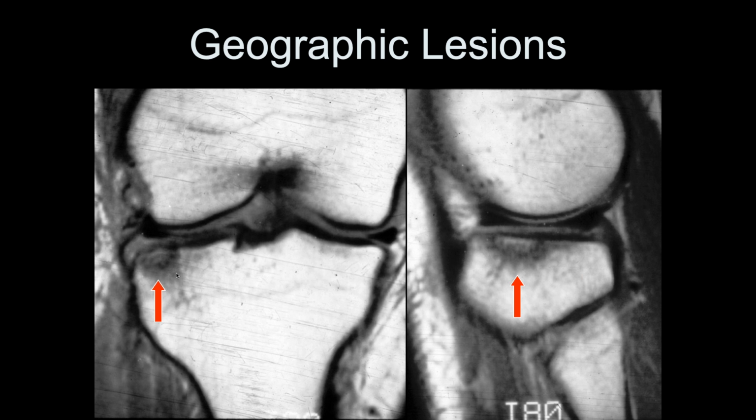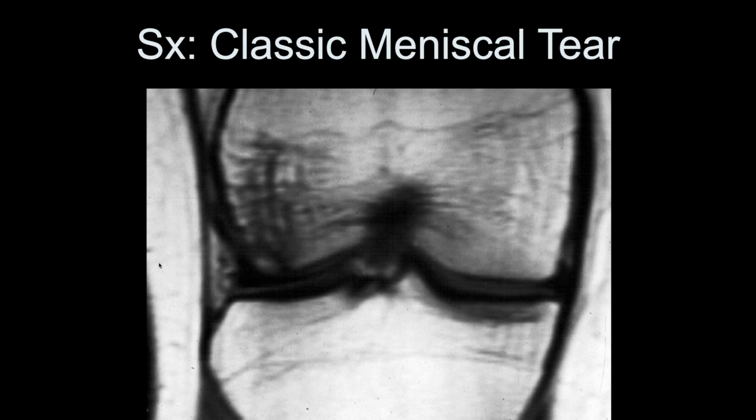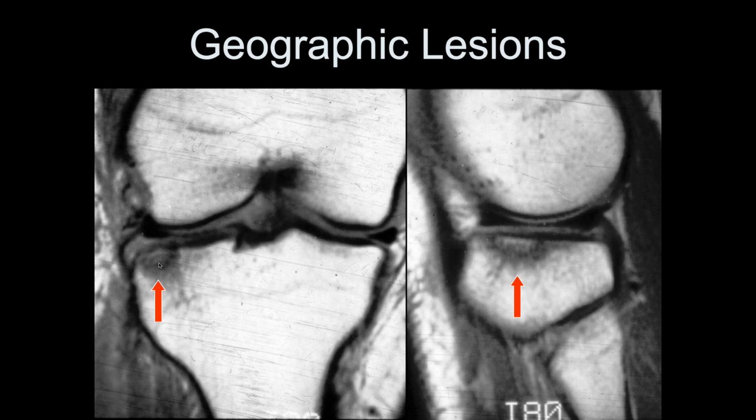In the majority of their cases, at acute arthroscopy with these, the overlying articular cartilage was intact, but then when they re-arthroscoped them 6 months later, over a half had destruction of the overlying articular cartilage. So these, we believe, are high-risk lesions. Okay, that would look normal on arthroscopy. In their study, the initial arthroscopy, the cartilage looked normal.